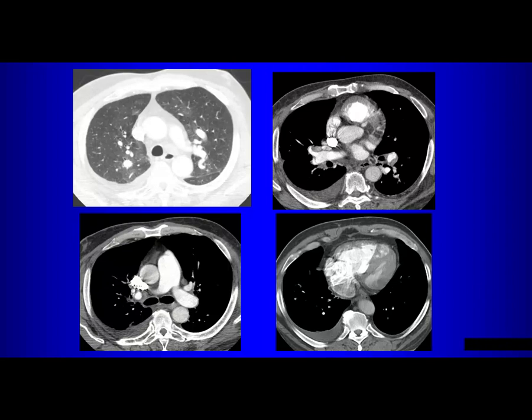On echocardiography, remember, they can give you an estimate of the pulmonary artery pressure, right? You've seen that in the echocardiography reports, yes? How do they do that? How can they possibly tell you what the pulmonary artery pressure is from an echo? You never wondered, my goodness, how do they do this?